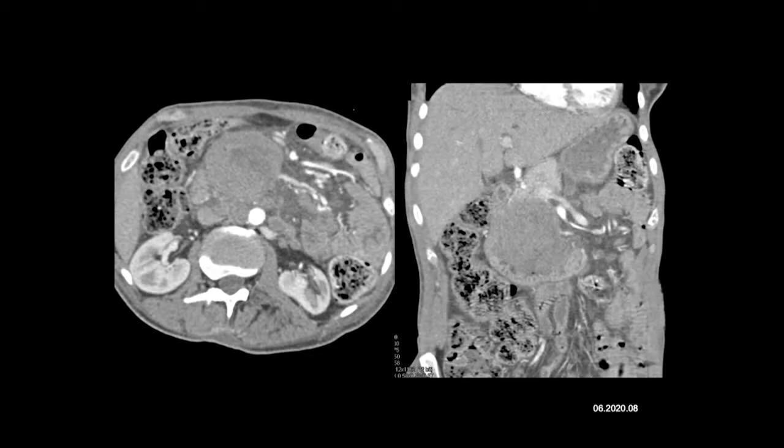The one thing, this is not a cystic lesion like a serous adenoma. Now we know serous adenomas can be solid, they enhance, but this is not enhancing. This is solid, it's pushing on the duodenum. In fact, this was metastatic melanoma to the duodenum, just a terrific case.